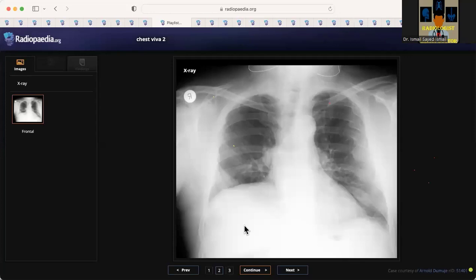So I've just put it in so we can go through the differential diagnosis. As you said, it could be lung causes, diaphragm causes, or abdominal causes that are causing this raised hemidiaphragm. So lung causes, any lung causes, what do you know of? It's like lung cancer or mediastinal lesions that will cause a phrenic nerve palsy.